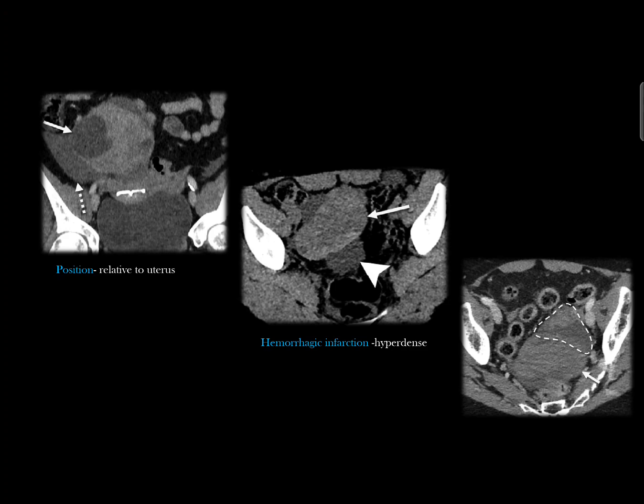The triangular thing that has been marked on the left hand side of the uterus is the presence of some soft tissue, the triangular mass of soft tissue. It is considered to be a relatively reliable sign, and we often mistake it for the presence of inflammation, but this is actually the presence of engorged vessels in the pedicle. It's the engorged vessels and the tube which give this appearance of a triangular mass of soft tissue adjacent to the torsed ovary or the torsed adnexa.